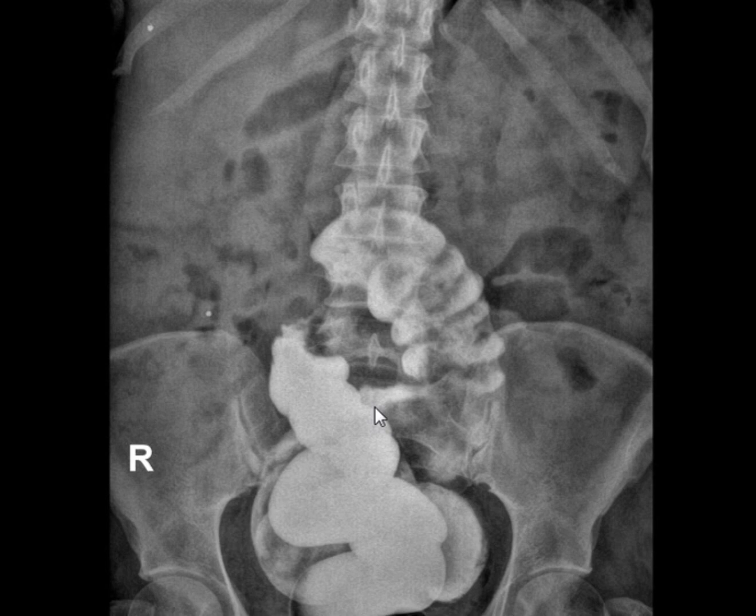This is a 32-year-old female. Lymphoma. Endometriosis, one of the very common causes of apple core lesion. Don't forget endometriosis in females. I don't know what this case turned out to be. I'm just saying the differential diagnosis could include endometriosis, a very common cause of apple core lesion, because the sigmoid colon is very close to the uterus. So keep that in mind always. It's not always colon cancer. Most of the time, but not always.